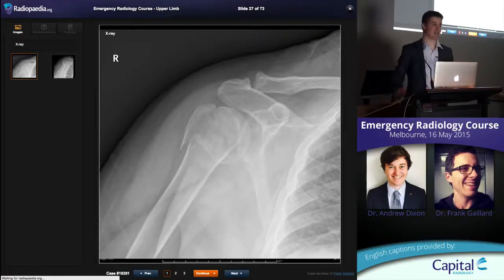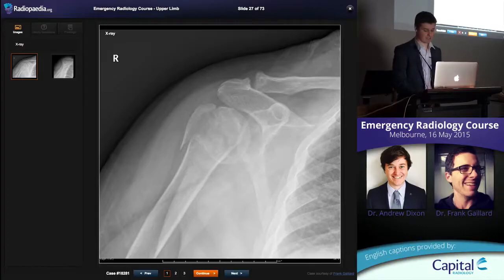Proximal humeral fractures, again, not many people come and ask me about these, so I'm not going to talk about them very much. There is a classification system, the Neer classification system. The important thing to know about that is parts. It's all about parts. Basically, a fracture part involves greater than a centimetre or 10 millimetres of displacement of the fracture, or greater than 45 degrees of rotation of the fracture fragment, and then you just add up how many parts are doing that.